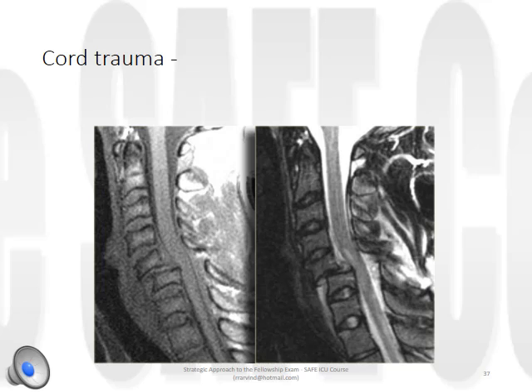If you look at the cord on the T1 weighted image, it's not all that dramatic. When you look at the T2 image, however, you see that the pathology, the water, is bright and it shows up brighter in the cord. If you're looking at the anterior line, you can see that that's also disrupted on both images.